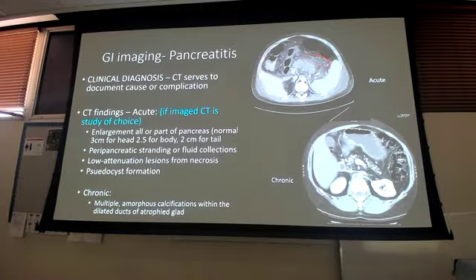But these patients are going to come with epigastric pain, intense epigastric pain. There's not very many things that are right in that area, okay? And so you're going to end up getting the CT. You're going to end up seeing this fat stranding all around where the pancreas is. So for those of you that are wondering, this is the pancreas.